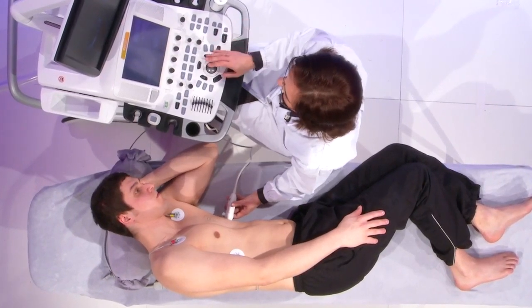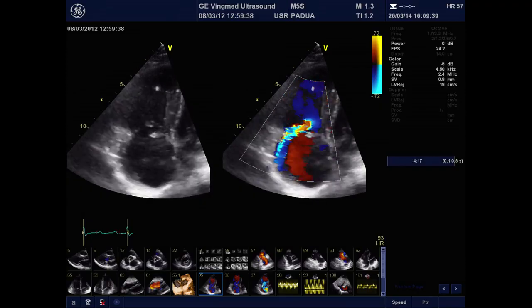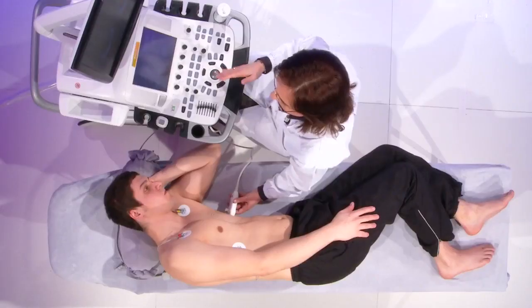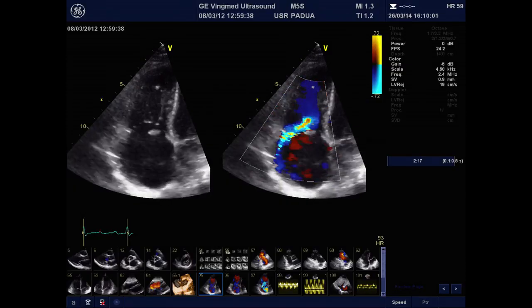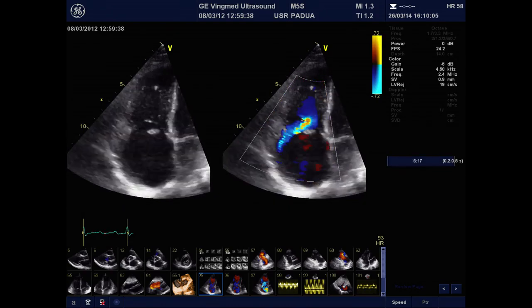In this case, in organic tricuspid regurgitations, since there is a swirling jet across the tricuspid valve that goes along the lateral wall of the right atrium, it is very likely that this jet can be underestimated. So the color flow and the jet area in this highly eccentric jet are not recommended parameters to assess the severity of the tricuspid regurgitation.